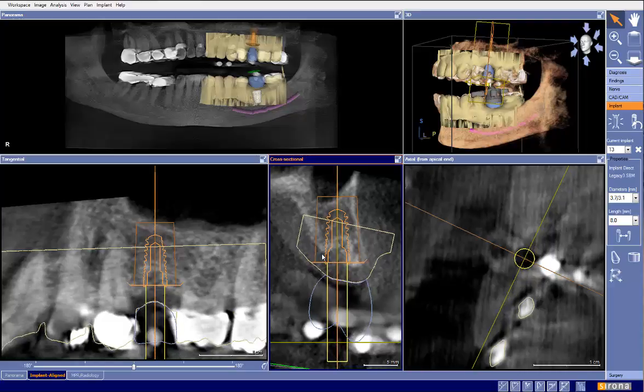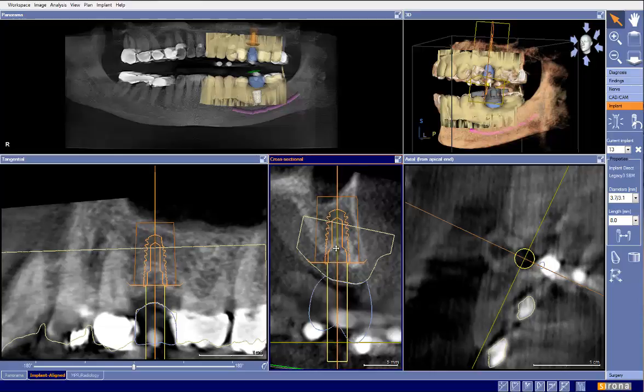Again, this part of the implant is not in bone. Again, it's on the palatal. That's very thick connective tissue here. I would probably lay a flap in this to preserve that keratinized tissue versus punching it. I'm pretty comfortable with this implant placement. It's not perfect, but I think it certainly will do for this particular case.